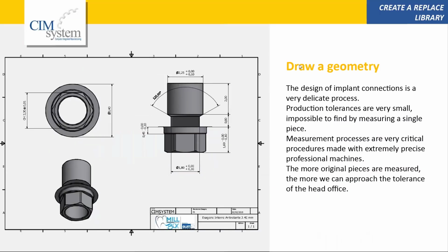We are talking about Implant Editor. It's a very useful tool, but we have to keep in mind that it's an add-on of Rhinoceros. So when you buy Implant Editor, you don't buy a Rhinoceros license. You have to have Rhinoceros already installed on your computer. Okay, this is very important.